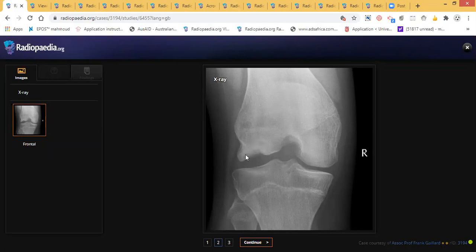When you find the appearance, especially if it comes in the characteristic site here, sometimes it comes here. So whatever, if you find osteochondritis, especially if the patient is young and you find this lesion, which is a type of osteonecrosis, you put a differential also of osteochondral lesion, yes.